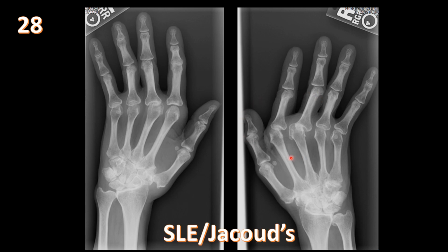So this is a case of lupus or deforming non-erosive arthropathy, and it's historically known as Jaccoud, which is associated to rheumatic fever, but now it's most commonly seen with lupus. So whenever you see ulnar deviation and a deforming arthropathy of the hand without erosion or bone destruction, think about Jaccoud, which is today mostly seen with lupus.